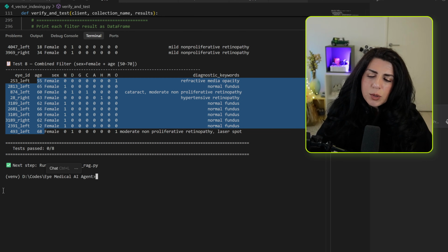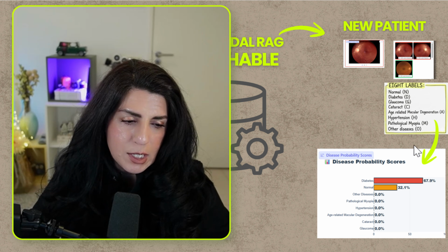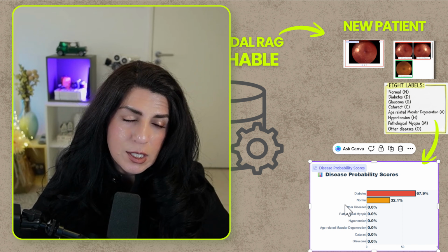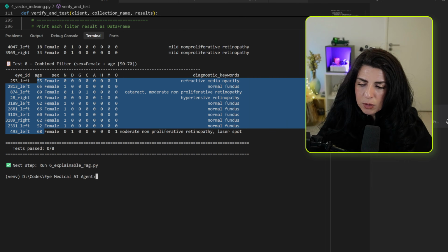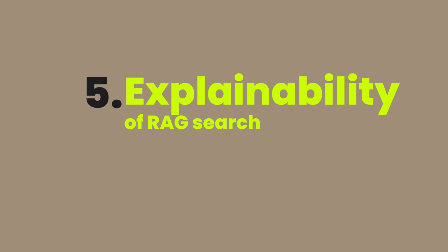At this stage, you could say we can go ahead and build our user interface, but doctors are never gonna accept just, hey, this is your diagnosis. What is the diagnosis based on? What is the support? We are going to do the explainability part.